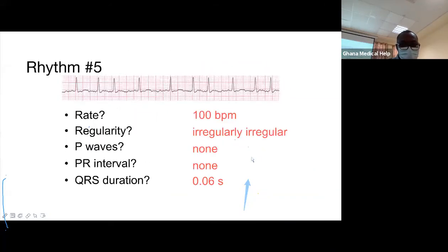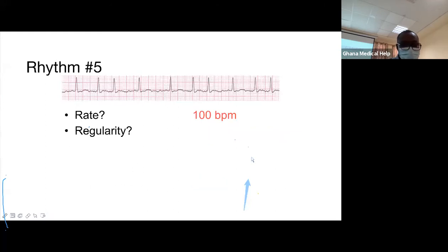Let's roll. Let's go here. All right. This is a normal ECG. We said that you want to see a P wave before a QRS. Every QRS should have a P wave, and it should be discernible. It should be seen, evident as the P wave, representing atrial contraction. And we said that between one R wave to the next should be the same.